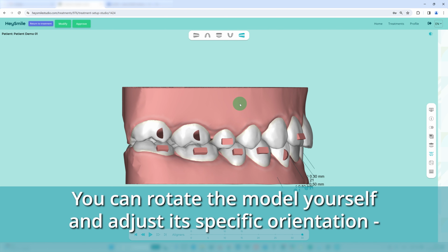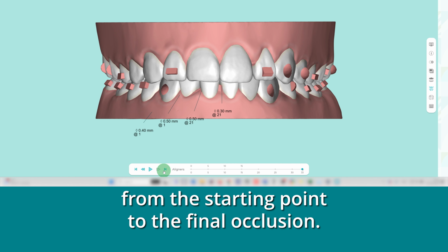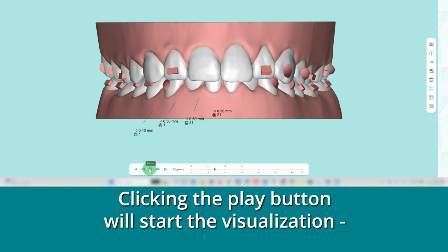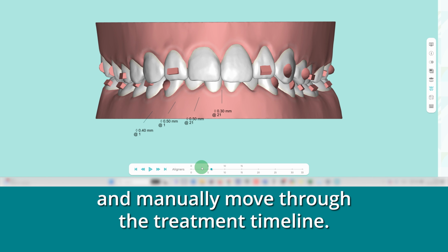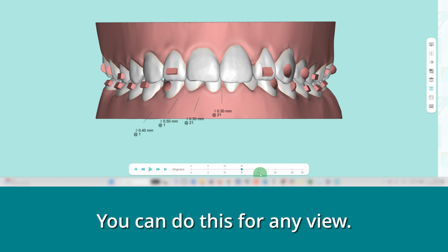The toolbar at the bottom is for the treatment's timeline. The buttons allow you to visualize the entire treatment sequence, from the starting point to the final occlusion. Clicking the play button will start the visualization and show all treatment steps consecutively. Click and drag the dot to adjust the slider and manually move through the treatment timeline. You can do this for any view.